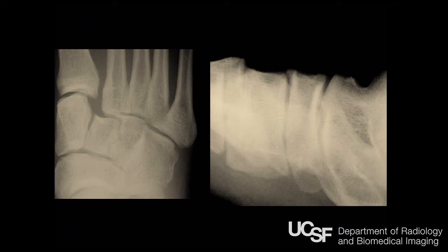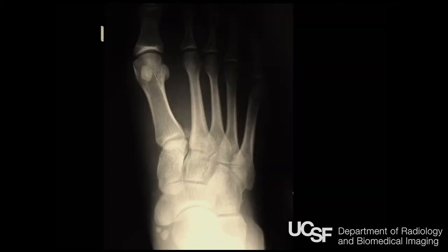Often you have to go to that. This is a real common injury that's commonly missed unless you go to the weight-bearing views. So if they have midfoot pain in a traumatic injury, get the weight-bearing views. If you get a CT scan, sometimes you'll be shocked at how many other little bone fractures there are in this region when you've got this injury. So that's the Lisfranc injury.